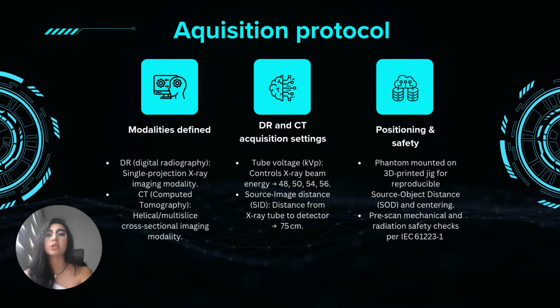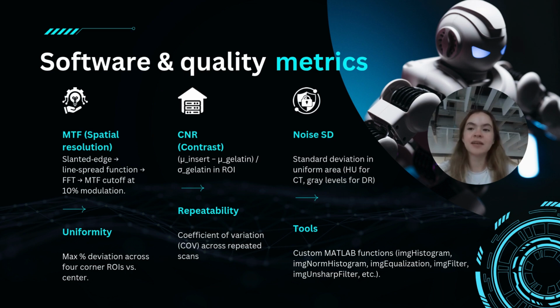Before each acquisition, we carried out mechanical and radiation safety checks in accordance with international standards, specifically IEC 61223-1 and the AAPM Task Group 18 guidelines. We then analyze the images using our MATLAB toolkit.